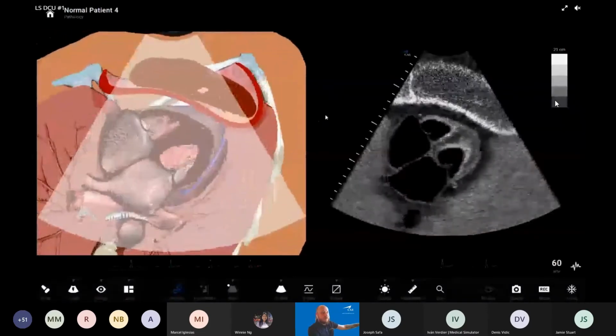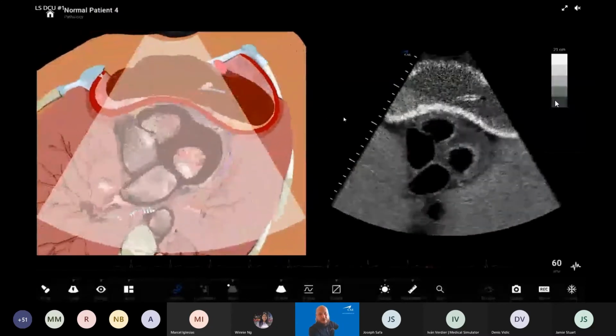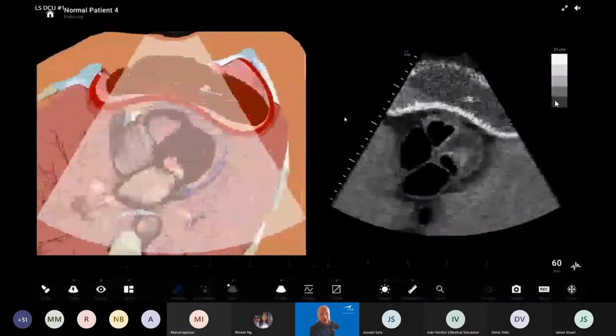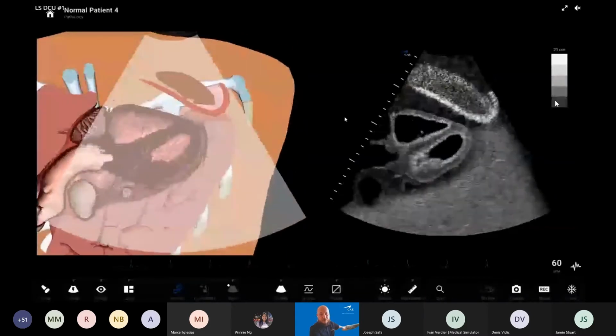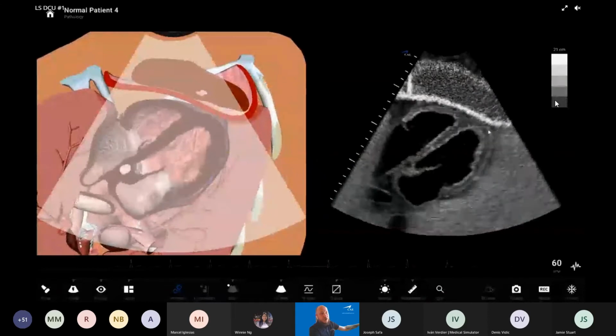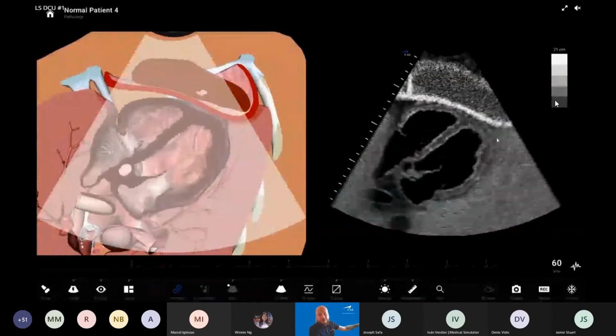As you can see, this is how it looks like. Yeah, much more realistic view. And I can tell you as a paramedic, more realistic heart, more realistic motion. If you look carefully on the apical side, it's akinetic, which is very important for cardiologists.